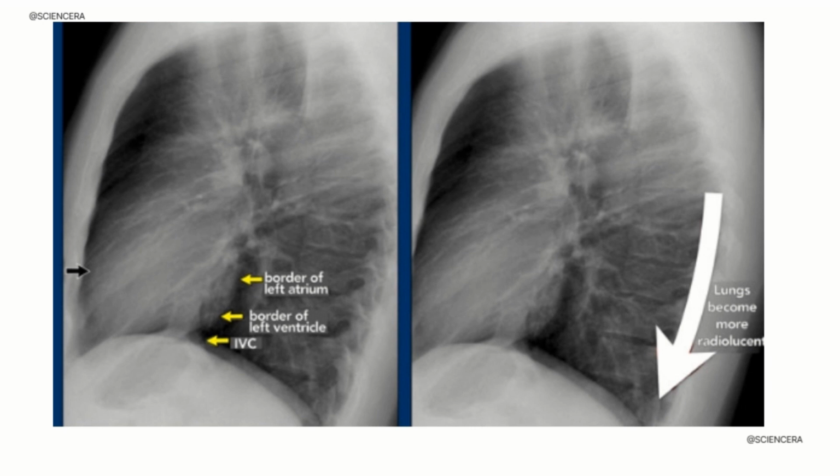of the heart and where the big veins like IVC enter it, and this helps them check if the heart looks normal. Normally there is air behind the breastbone, the sternum, and it looks dark on the X-ray. If there is any brightness or radiopacity in this space, especially at the top near the heart, it might mean there is something wrong in the front part of the chest or the upper part of the lungs.